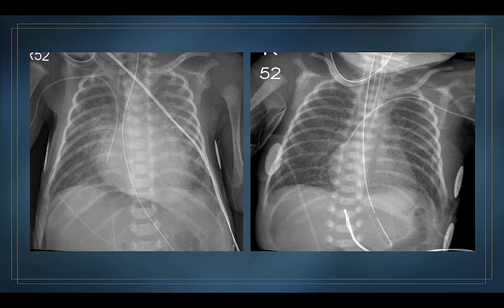It's not necrotizing enterocolitis. The baby has no clinical or laboratory findings pointing to necrotizing enterocolitis, and these babies obviously tend to do a lot better than a baby that has true NEC. Often they're treated with simply a peritoneal drain, and probably up to a half of them won't require any further surgical intervention. So these are probably both examples of so-called SIP, which is a fairly common cause for a spontaneous pneumoperitoneum, but probably less common than necrotizing enterocolitis, but both predominantly seen in premature babies.